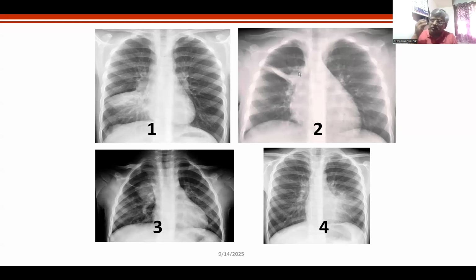It's simple. Pneumonia is the simplest thing that you can diagnose. Actually, other things are difficult. That's why I'm spending more time on other things. Because if you know the other things, then the pneumonia becomes simple. If you don't know all these things I have told you, expiratory film, inspiratory film, everything, then the pneumonia is difficult for you. If you know all the things that I have told you so far, then the pneumonia becomes a diagnosis of exclusion. Pneumonia, therefore, is a diagnosis of exclusion of the normal and interpretation of the abnormal.